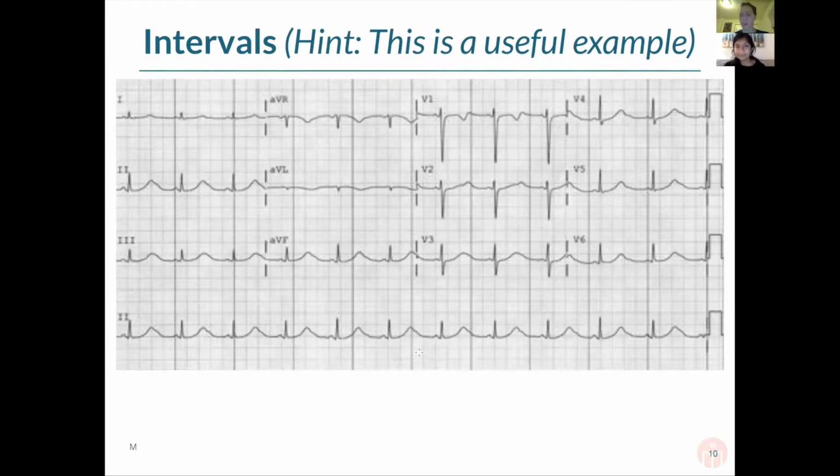Again, that's not going to give you a number, but if you're looking at EKGs really quickly, or you're running out of time on step, and they want you to notice that the QTC is long, that could be a quick and dirty trick to just say, "Ooh, I think that's long. I don't have time to calculate it, but I think that's long." That's something I like in clinical practice too.